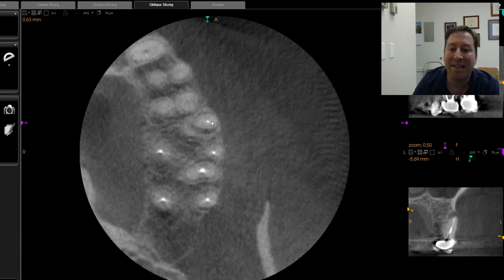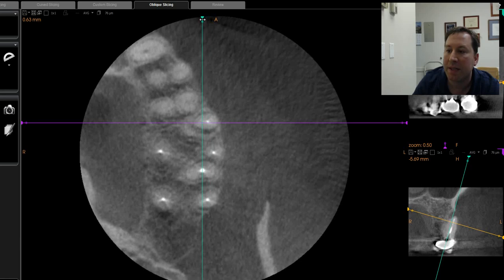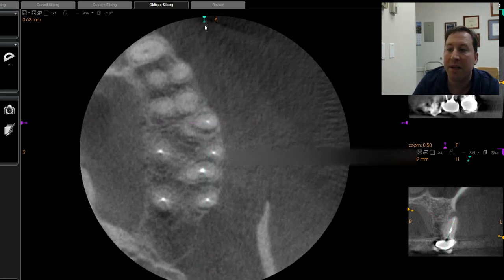If you see it not centered, basically it's an indicator that there is another canal or an extension of that canal that is present. So we informed the patient that we suspected that there might be a portion of the tooth that might not have really been thoroughly debrided, and that it was very difficult to get in there. We do not impugn anyone's previous work, but that being said, certain teeth like this, which have very difficult anatomy, sometimes it takes a specialist to clean it out.